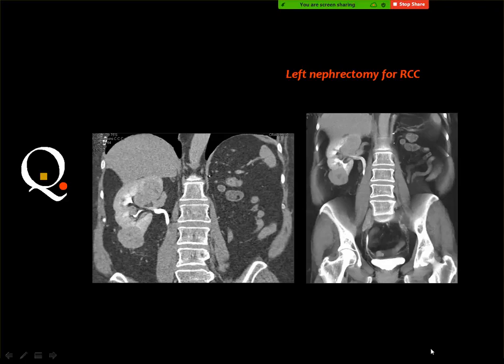Renal cell carcinoma. On which side? Right side. What about left kidney agenesis, or maybe metastasis? Yes, nephrectomy. The left kidney is removed because of renal cell carcinoma, and these are metastatic deposits to the opposite kidney.